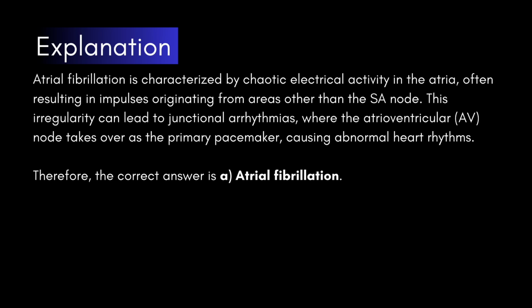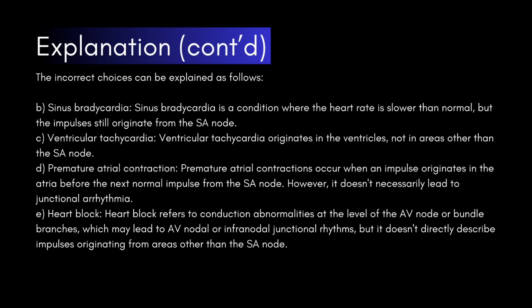Moving on to see why the other answer choices are incorrect. Sinus bradycardia.